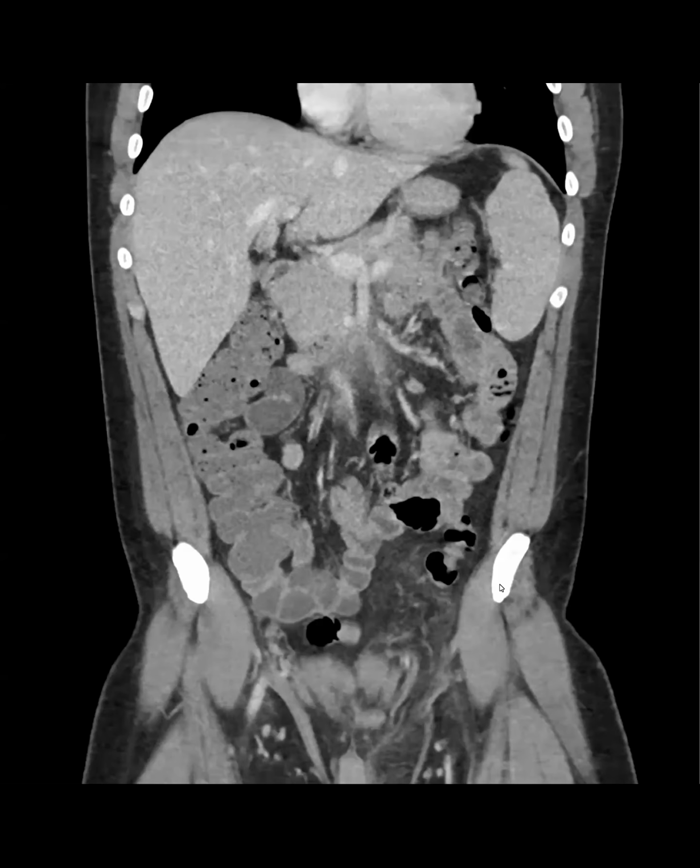So what usual differentials would we have given? MCNs, I mean, this is huge and it's big. So presumably if this is not a pseudocyst, then this needs to be EUS'd. I think also IPMN. I'm trying to see if the duct is connected to it, and on the post-contrast I almost felt like it might be connected. But usually IPMN doesn't have a capsule, and this almost has a feeling of a capsule.